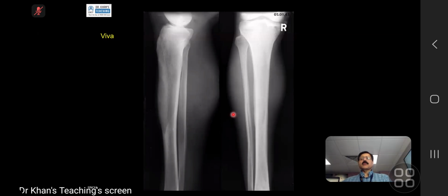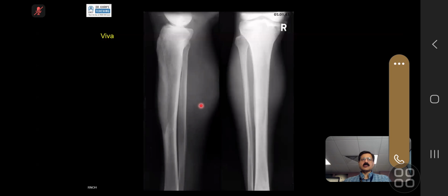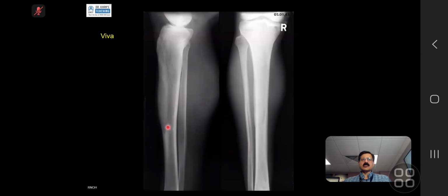Excellent, well done. Now, the lytic phase of Paget's disease, at times, those candidates who haven't seen it find it difficult to diagnose, and this is an example. Paget's disease, by definition, is a disease in the long bone which goes to the subarticular portion of the bone. So remember that, subarticular. One exception is the tibia. In the tibia, it might go just to the tibial tuberosity.